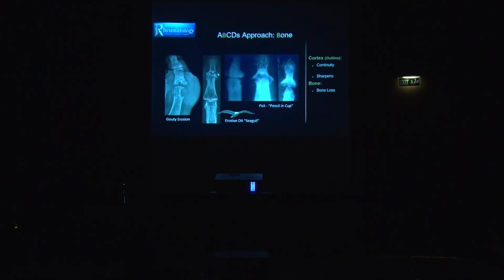Sclerosis on X-ray means it's more white than normal. Sclerosis means there is more bone than normal, so it makes it more white, and it's called subchondral sclerosis. It happens in osteoarthritis because of a process of the body trying to repair the damage. When they try to repair the damage, they synthesize more bone. But sadly, it doesn't help the problem. It just accumulates there, and it gives you this sign on X-ray, subchondral sclerosis. So these are all signs of osteoarthritis: subchondral sclerosis, osteophytes, central erosions.